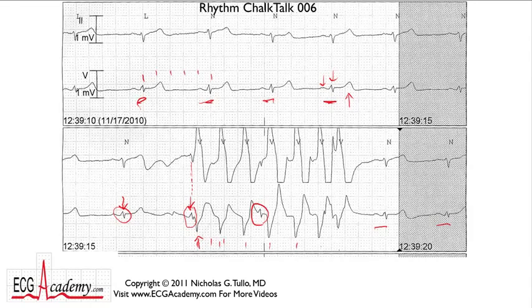Well, let's get our calipers back out again. And if we map out these signals, and given that there's a little bit of sinus arrhythmia and you'd expect a little bit of irregularity, there seems to be something that's right here. And if you bring our calipers back out, this beat occurs on time, plus or minus a couple of small boxes, but remember there's a little sinus arrhythmia going on. So what do we have here?